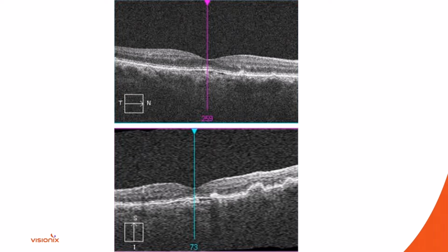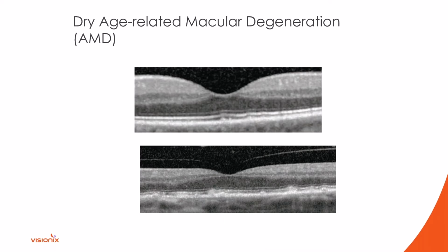This patient, there was their OCT here, and you can see this dry macular degeneration. We've got a bumpy outer retina, the RPE, yet we're not seeing any fluid at this point. Again, this OCT really appears to be a dry macular degeneration. So when you're looking at OCTs, again, not OCTA yet, but OCTs, we are looking at a picture that you look like here.